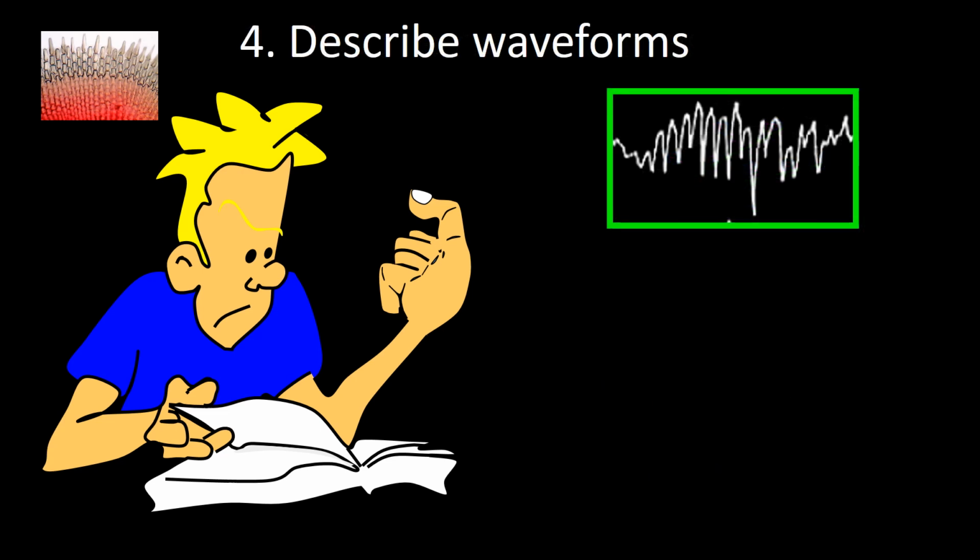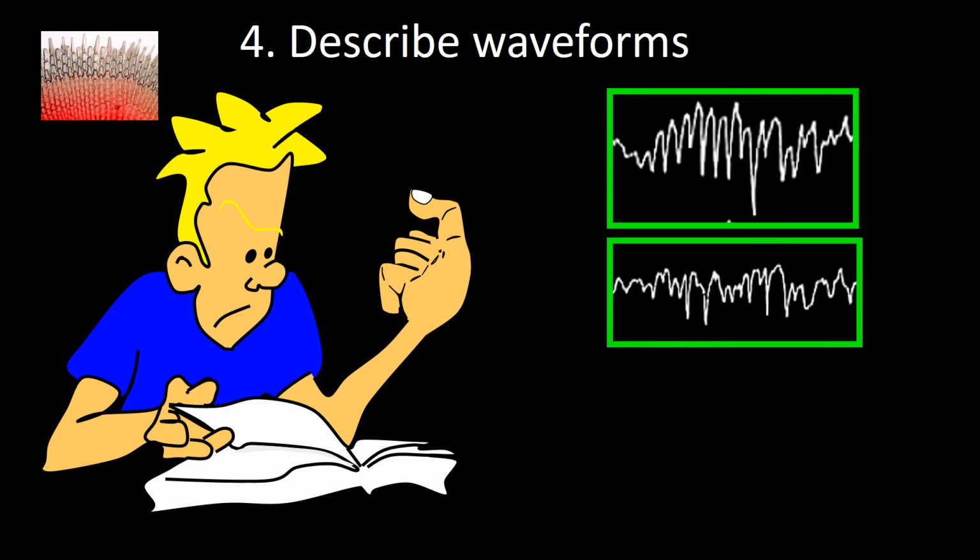The burst is made of spikes of variable size; lower amplitude elements are usually at the beginning and at the end of the burst. This arrangement is not always present, and at times tall and short spikes are intermixed.